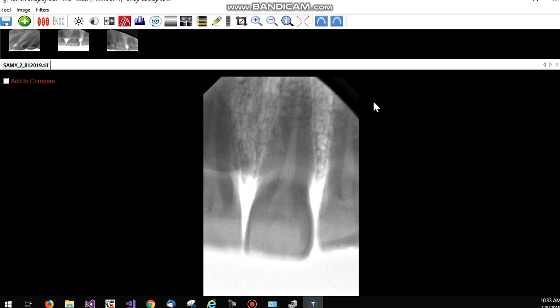This brings us to the image manipulation screen. Here you will see all the images that ever existed for this patient in any shape or form. Like you see, we see our default image with the image that we selected on the grid. Here you can do several operations. You can do brightness and contrast using the first two buttons in the grid.